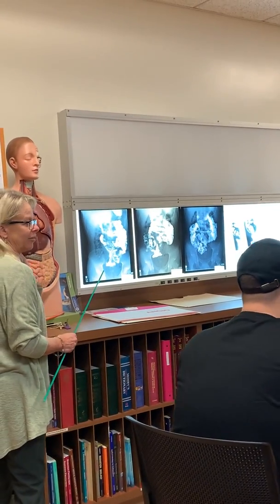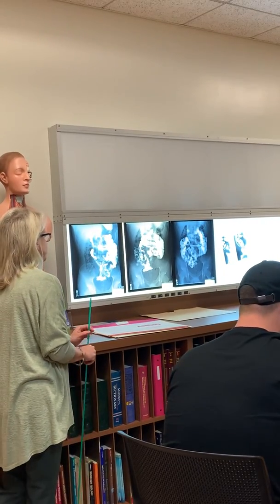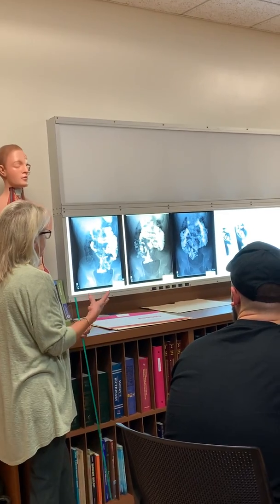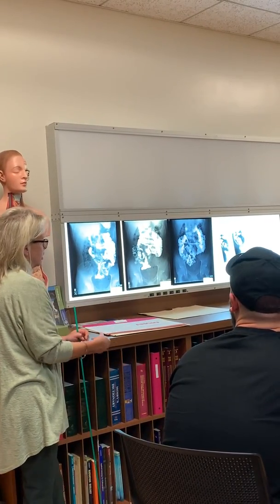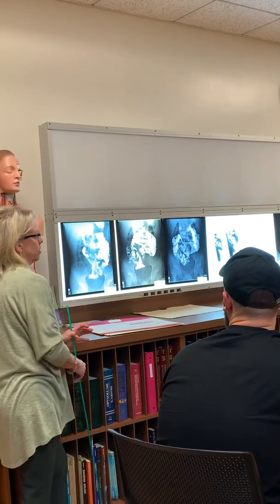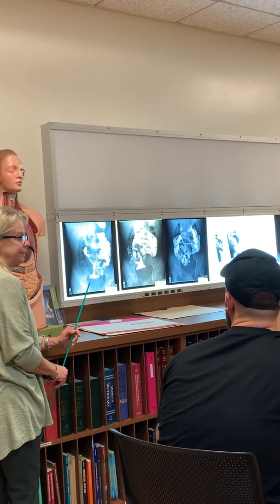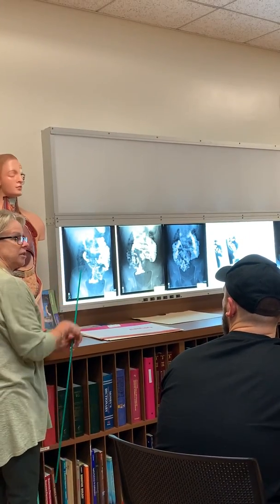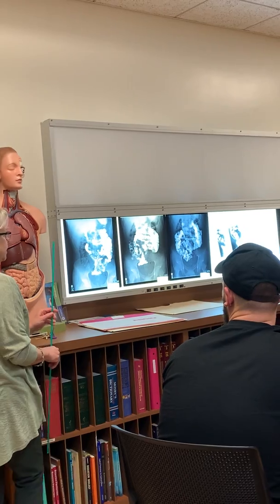Yeah, I know. Usually what they do, not always, is take an image every 15 minutes for the first hour. After that, the second hour, it's every half hour, and then after that, it's just on the hour. They'll take an image until it reaches the large intestine, until it reaches the cecum.